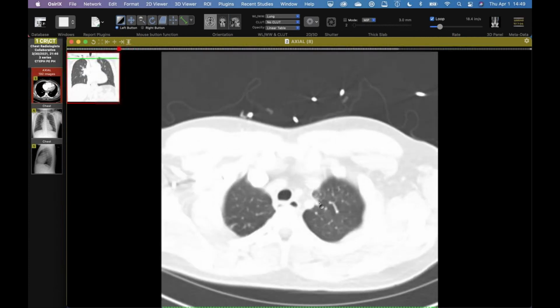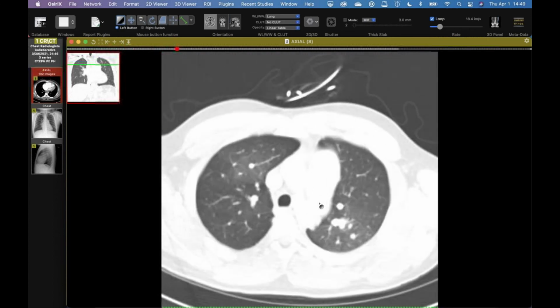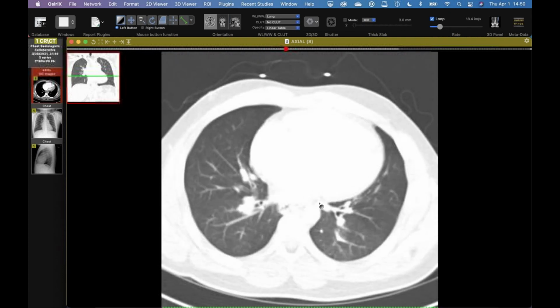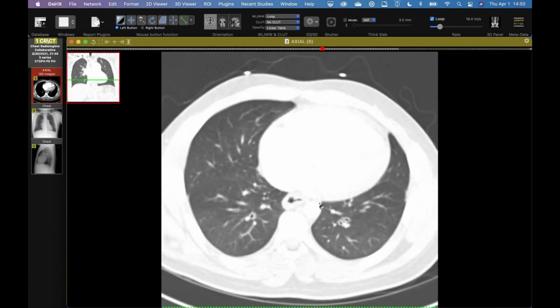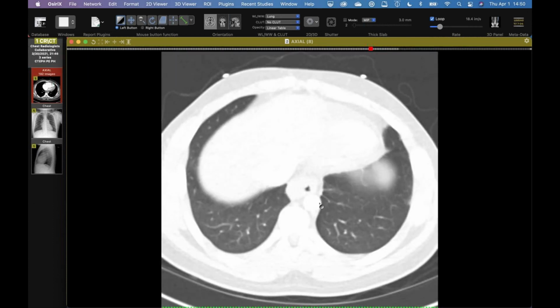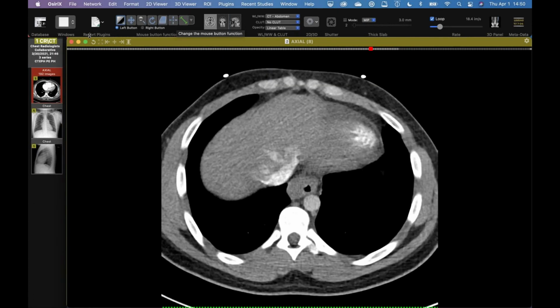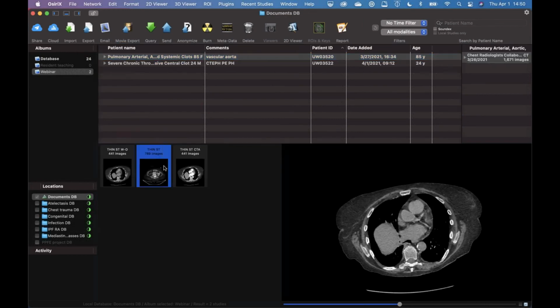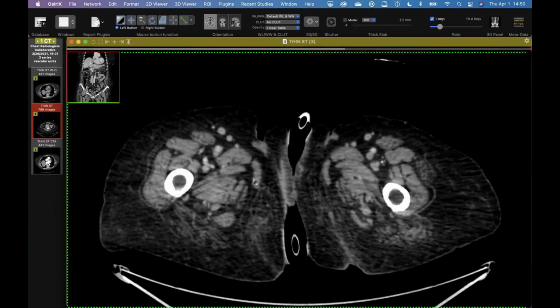That would not go with a sarcoma because they're pretty aggressive, and I don't think you'd have enough time to develop all that. And the distal vessels don't contract like that in sarcoma. See how your distal vessels are contracting? As it grows in, it'll expand the vessels out. Right. And that's always a good question because it's often misdiagnosed or diagnosed late.